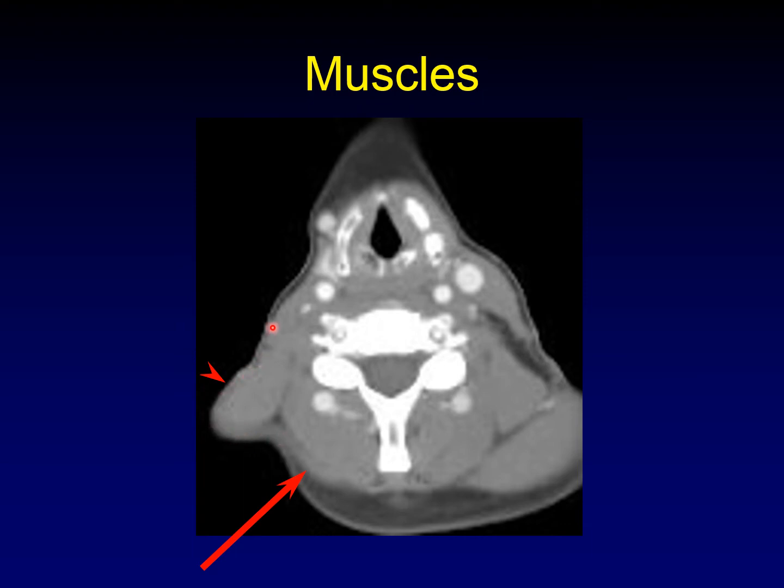You can imagine what the clinical contour of the neck here is. This can look just like a mass clinically and of course radiologically, and you saw how much FDG avidity was in that hyperfunctioning levator scapulae muscle. A confusing overall appearance. The association of the muscle fibers with the FDG uptake is your clue, and a solid knowledge of this physiology, what happens when you sacrifice the spinal accessory nerve.